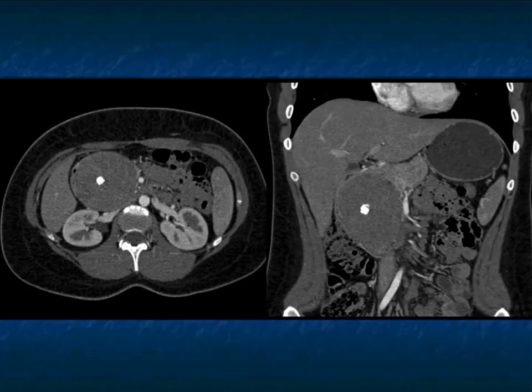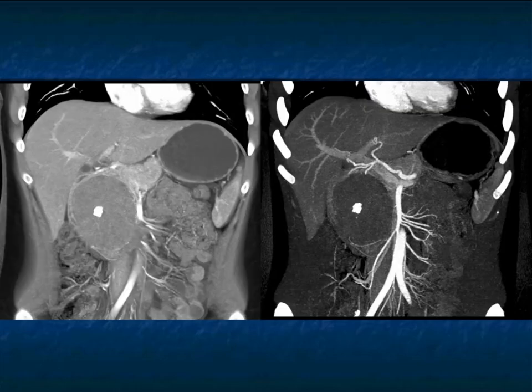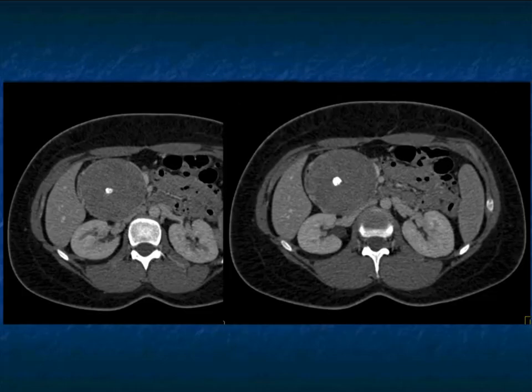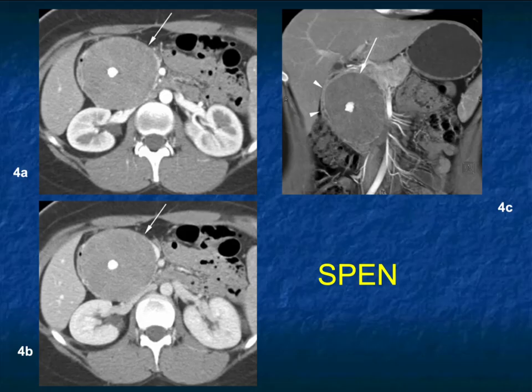The lesion has that central calcification, but when I see central calcifications, I'm always thinking about serous cystadenoma. Though typically I talk about spiculated calcifications, not this big clump of calcium. You can see some stretching of the vessels here, a good size mass, shown nicely in arterial and venous mapping. And this indeed was a SPEN tumor.